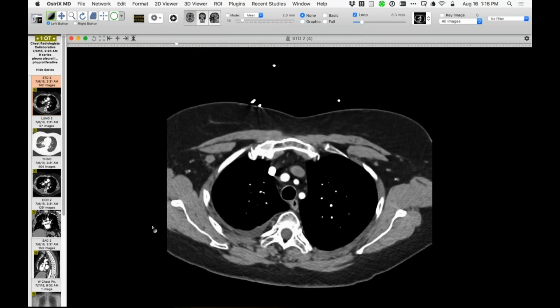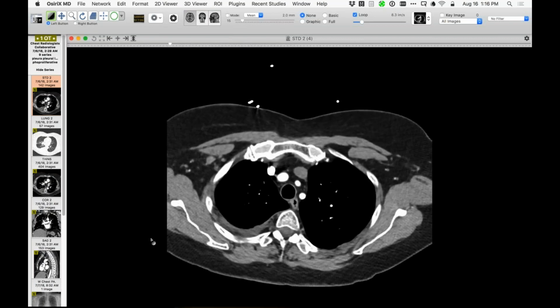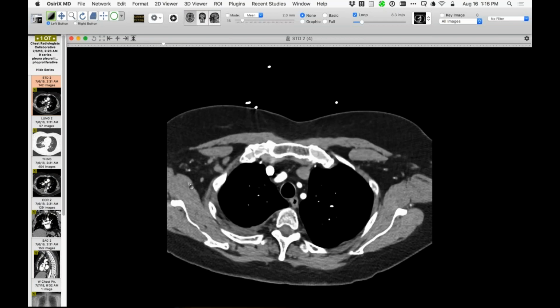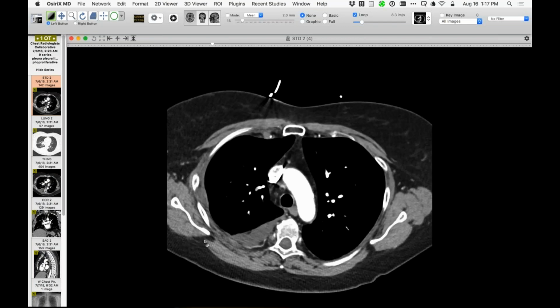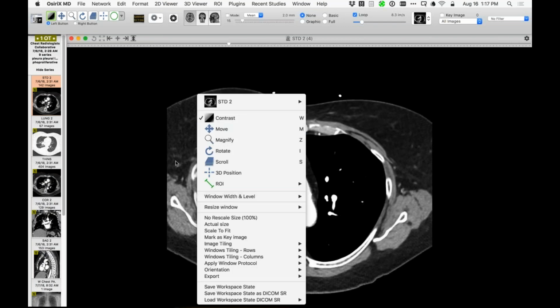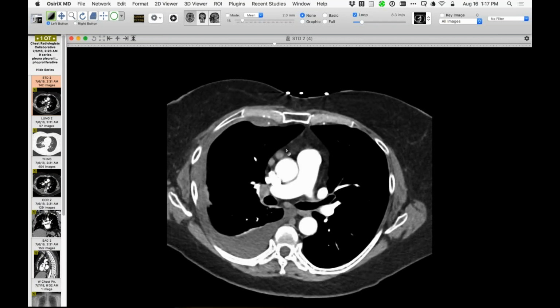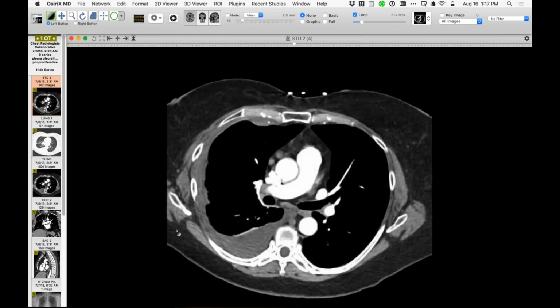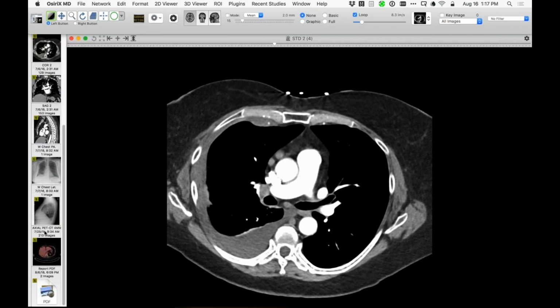And then the other findings I mentioned were a couple of lymph nodes that were seen, but not too much was made of those. So up here in the axilla. But clearly, if you decide that the pleura is very abnormal, then the pretest probability that those lymph nodes, even though they're not huge, are also very abnormal increases substantially. So we don't have just a simple right pleural effusion.